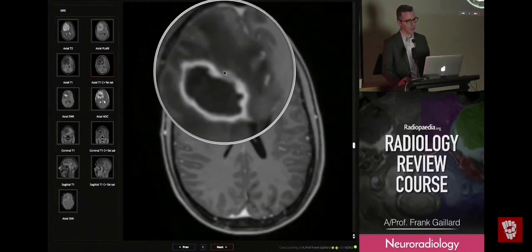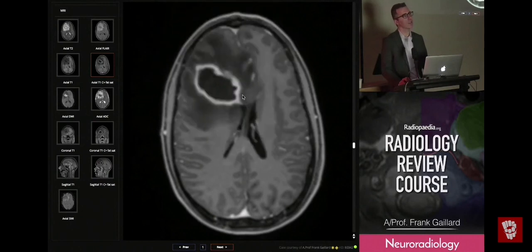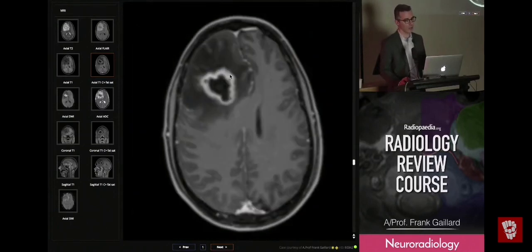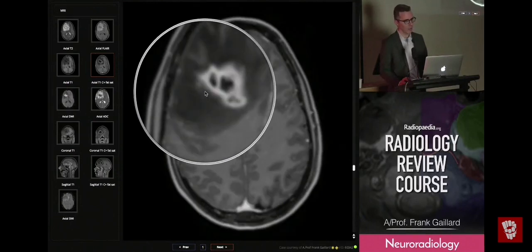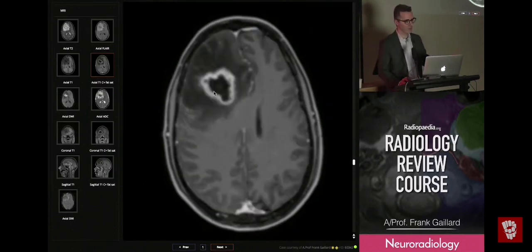The other thing to note is that it also has a bit of a fuzzy margin. And it's kind of interesting that the fuzzy margin of lymphoma that's created by lots of white cells within the brain is the same as the fuzzy margin around an abscess, which is created by lots of white cells within the brain. And these are migrating towards that edge. It's not a perfect, sharp line. It's slightly hairy. The term hairy is used, which is kind of weird, but I think gets the point across. You might get some little pockets of additional pus that sort of get walled off.